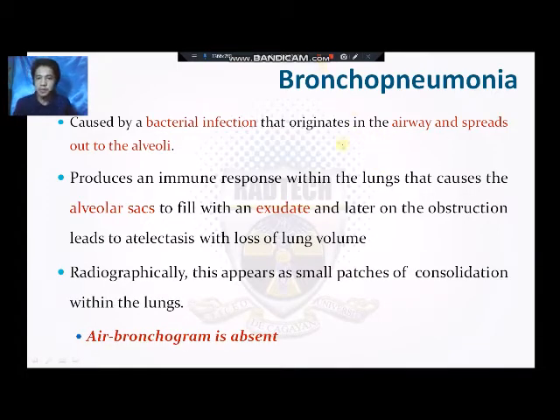Radiographically, it appears as small patches of consolidation within the lungs in which, if ever makita natin siya sa radiograph, the air bronchogram sign is absent. So try to compare that with lobar pneumonia. In lobar pneumonia, the air bronchogram sign is present, while in bronchopneumonia, the air bronchogram sign is absent.